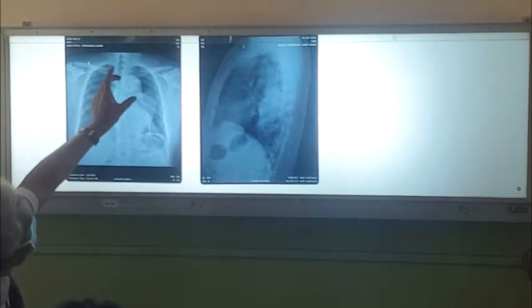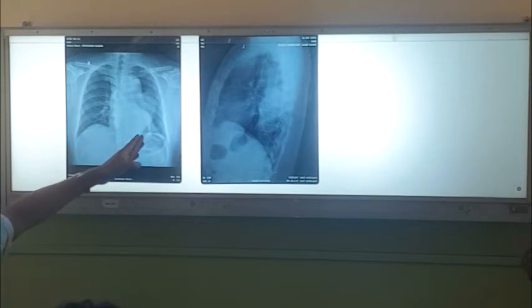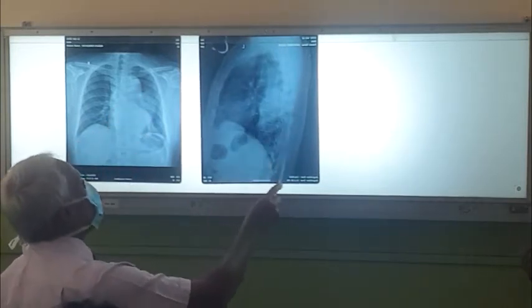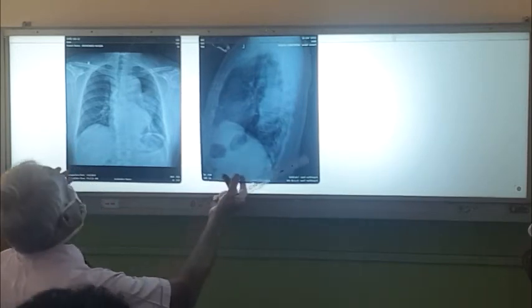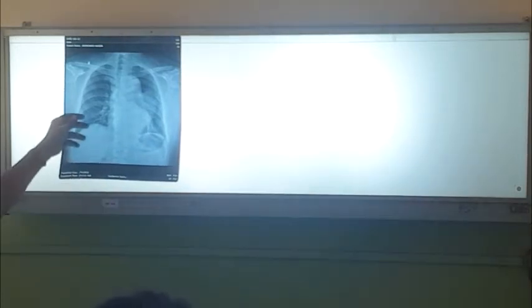So this is a very big aorta, and from here it is going like this. So bulging, leaking aortic aneurysm. So this is a leaking aortic aneurysm there. So in its CT it was leaking and bulging, a dissecting aortic aneurysm. So history is very important.